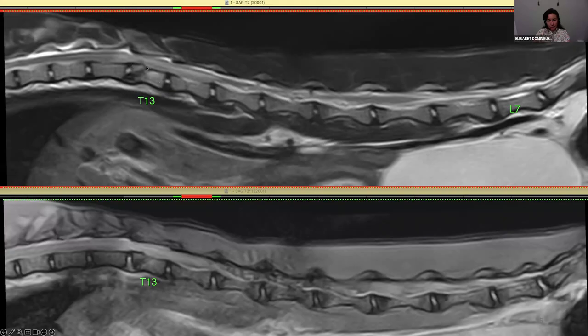And we see here in the cranial aspect that there's a black, a hypointense oblique line that runs through the cranial end plate of the vertebra. And dorsally, this vertebra shows a small step in the dorsal margin of the vertebral body. So we have a misalignment here of the vertebral canal. And at this level, if we compare dorsally, we see also that the arch is ventrally located.